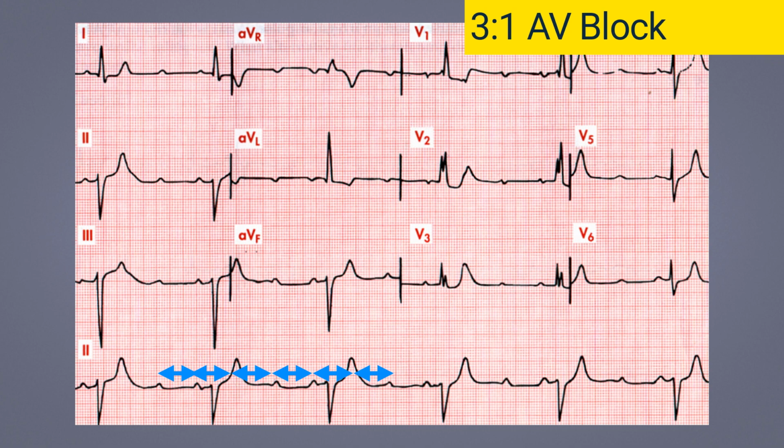Consequently, this patient likely has a severe bradyarrhythmia, causing syncope due to a significant disorder in atrioventricular conduction, and a permanent dual-chamber pacemaker should be implanted.